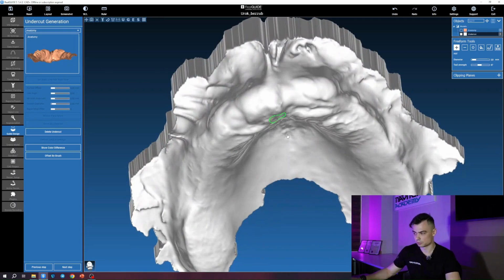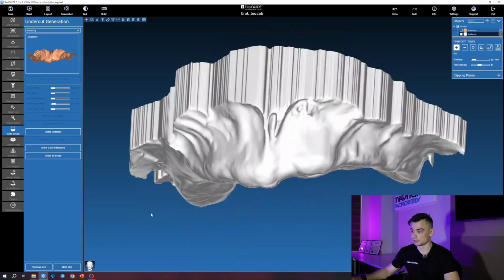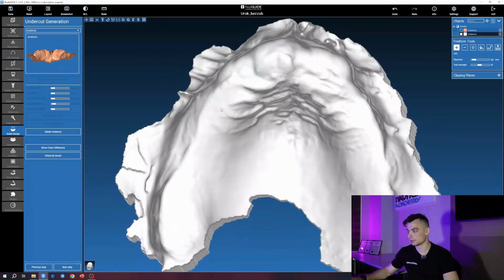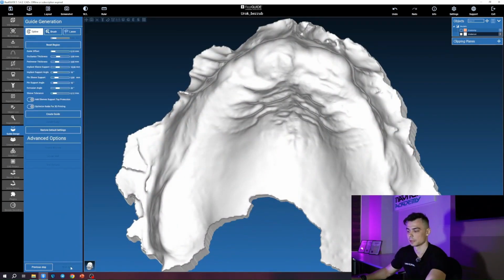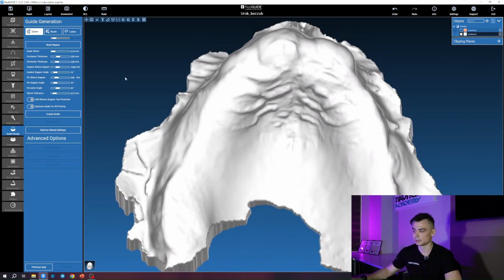These areas just look too much like extraction sockets of removed teeth. And then basically I continue examining this model as well. Overall, I'm satisfied with everything. I click next step. After that, that's basically ready for production, so to speak, for modeling the templates.